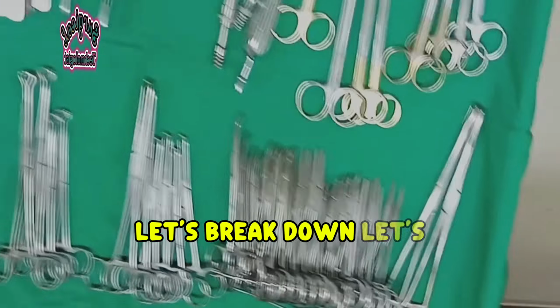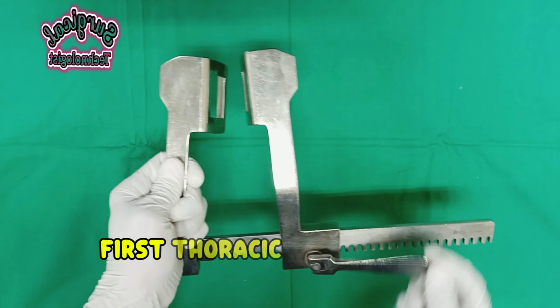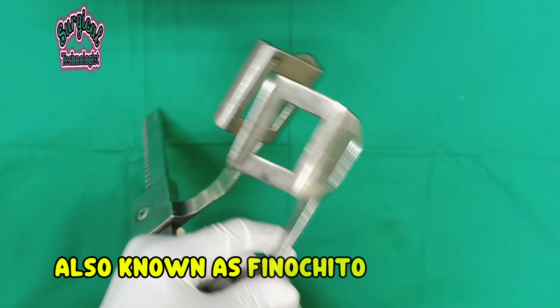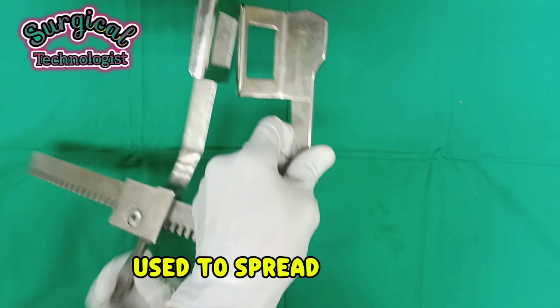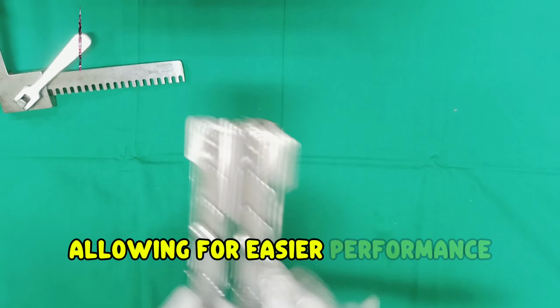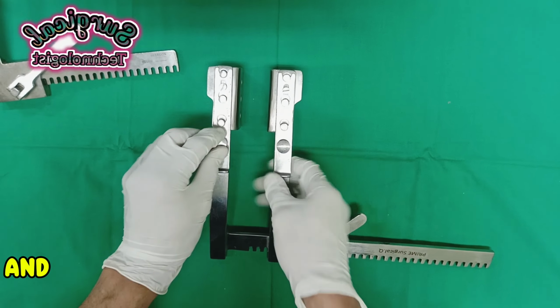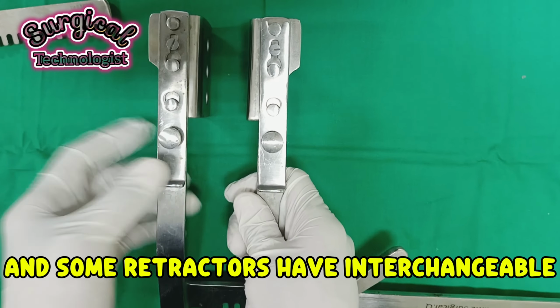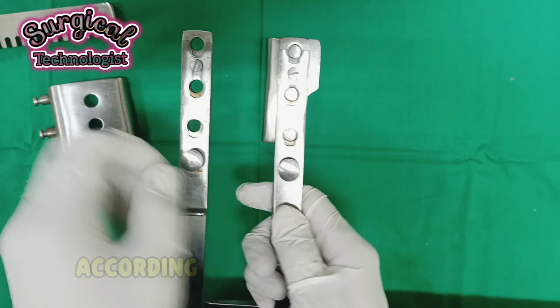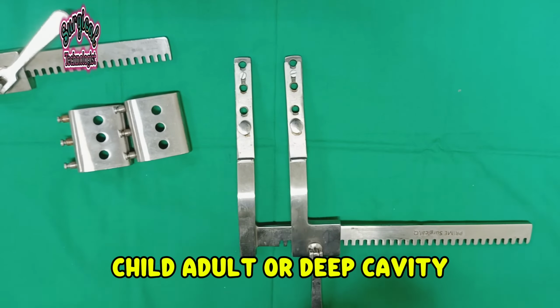Let's break them down one by one. Alright. The first basic thoracic surgery instrument is the rib spreader, also known as a retractor, used to spread the ribs to gain access to the thoracic cavity, allowing easier performance of prolonged surgeries. It's available in different sizes, and some retractors have interchangeable valve and blade attachments, enabling adjustment of blade sizes according to the patient: infant, child, adult, or deep cavity.